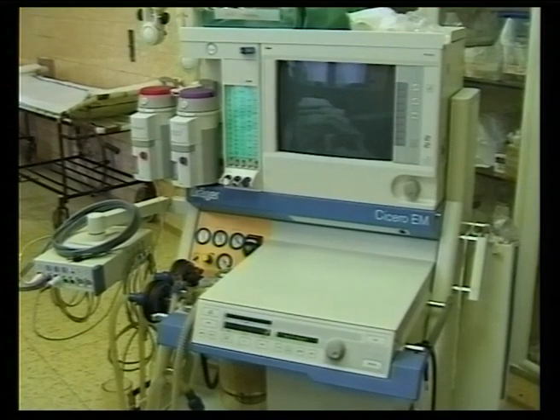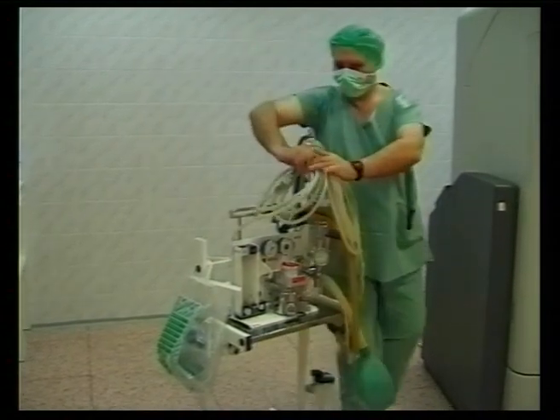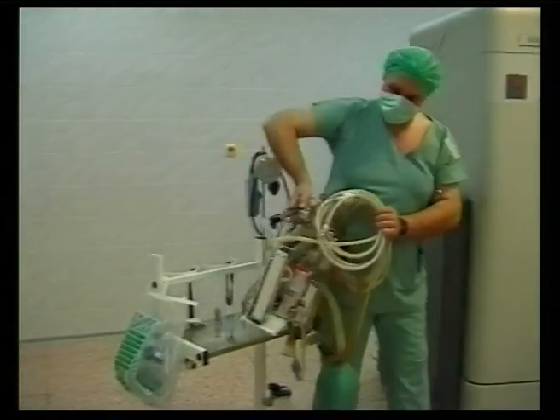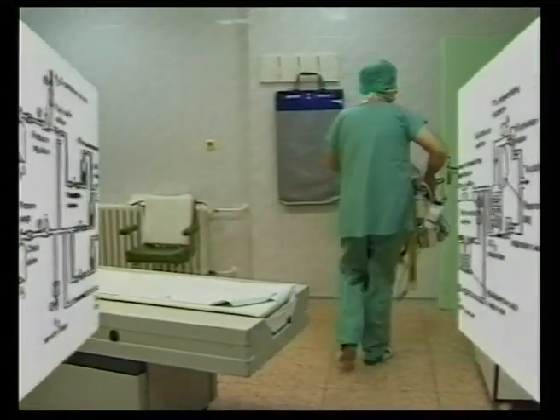At first glance, there are many different types of anesthetic machines, from the most sophisticated to the simplest ones, some of them even being portable. However, they are basically made according to the same scheme.